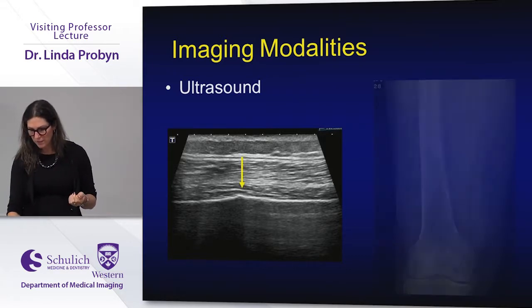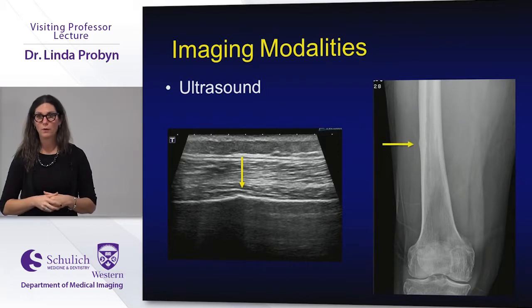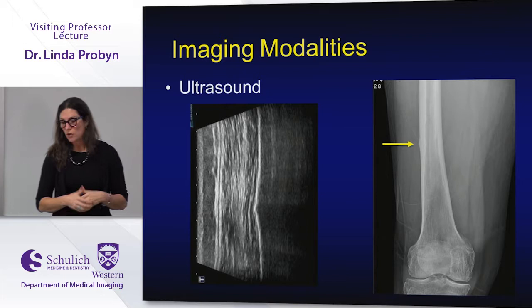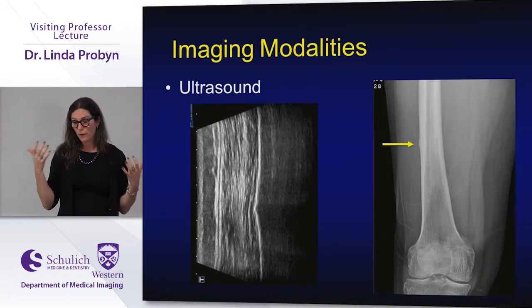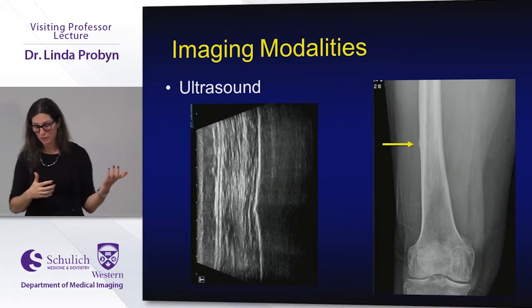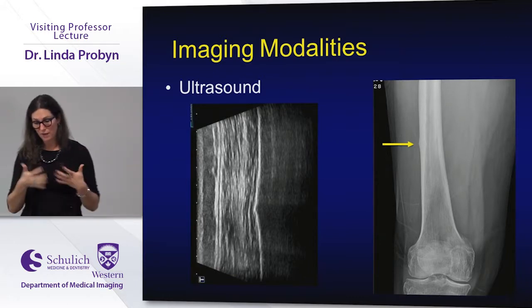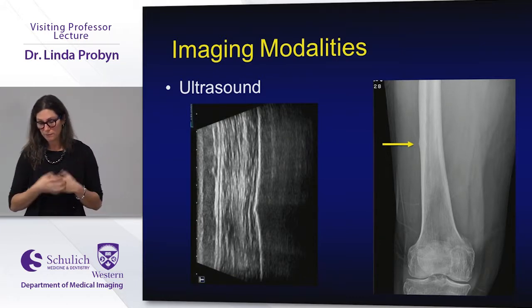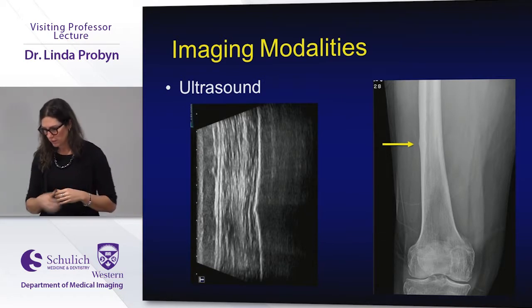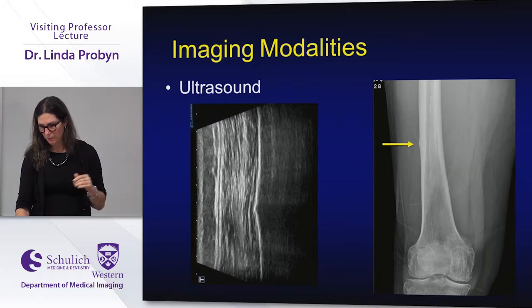And so you can see the little bump there. So we got an X-ray, and there it was. I'll just flip that around so you can see the correlation. So again, if we're not aware, we won't find it. And that certainly was not what I was looking for. But as soon as I saw that little bump, it was pretty clear to me that that was likely the cause of the pain, and there was no quads tear. So just again, to keep it on the radar.